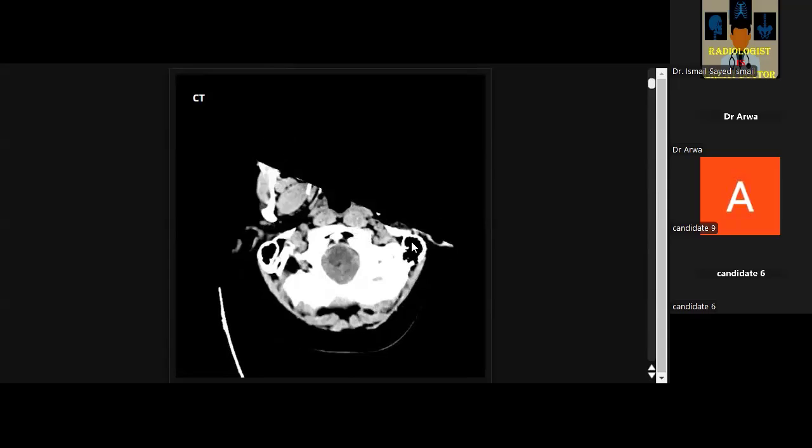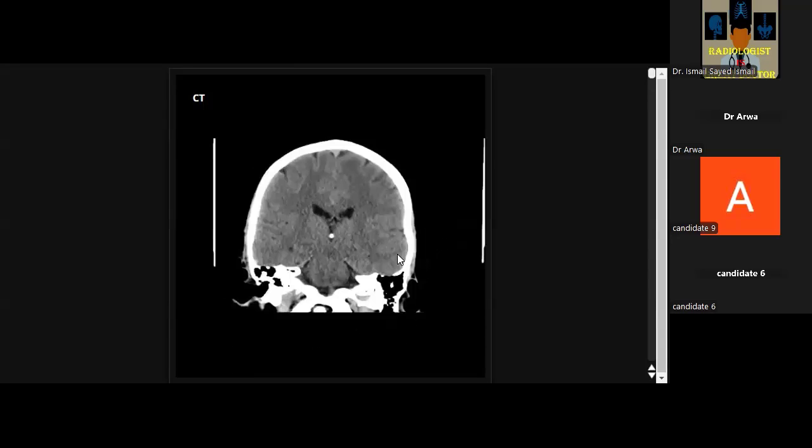Yes, here. Diagnosis is here. In the last cut, diagnosis is here. There is crowding of the foramen magnum as well, which is likely due to herniation of the tonsils. I would like to confirm on the sagittal images.